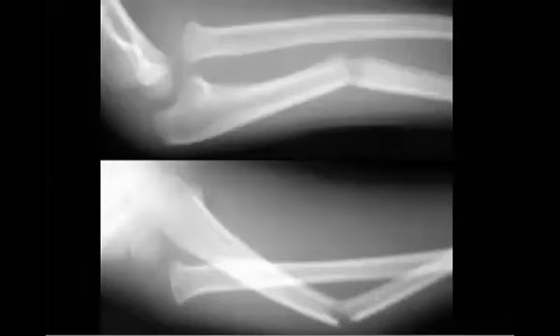Let's shift again to musculoskeletal, with a trauma patient. When it involves one of the forearm bones, remember either Monteggia or Galeazzi fractures. When you find Monteggia, you are talking about a fracture with dislocation.